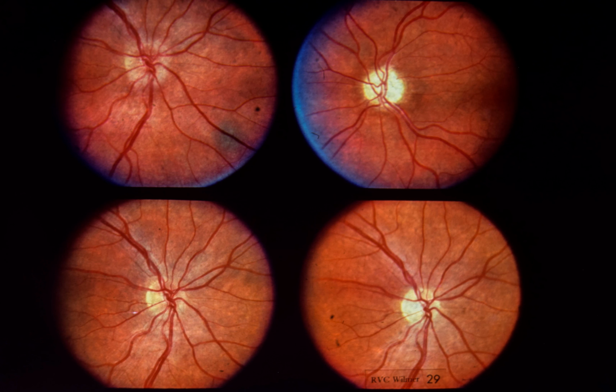Upper left. The right optic disc shows mild edema and hyperemia with blurring of the disc margin. There are no hemorrhages or exudates. Upper right. The left optic disc is pale with loss of the nerve fiber layer. Skull X-rays and a CT scan were normal. Lumbar puncture revealed clear cerebrospinal fluid with normal opening pressure, normal protein, and a mild pleocytosis. Myelin basic protein immunoassay was positive, indicating a demyelinating process. Steroid therapy was initiated, and visual acuity improved slowly.